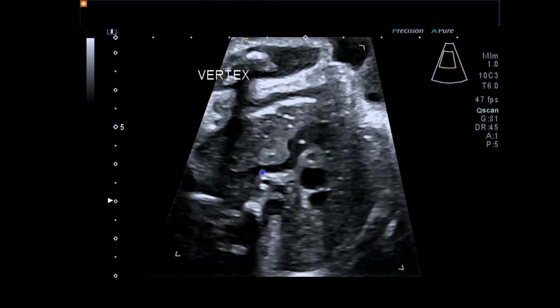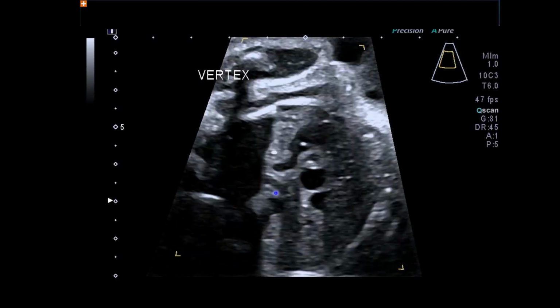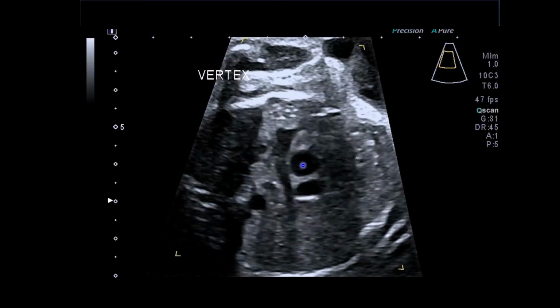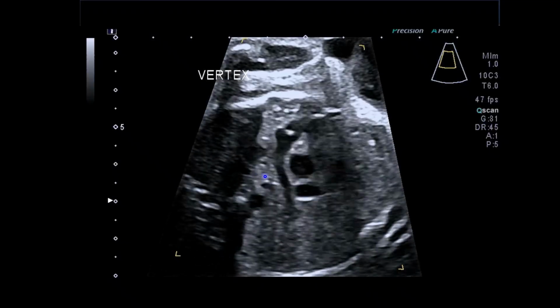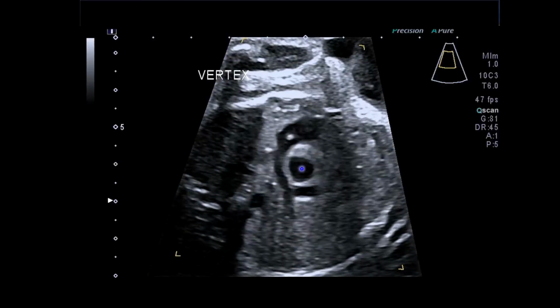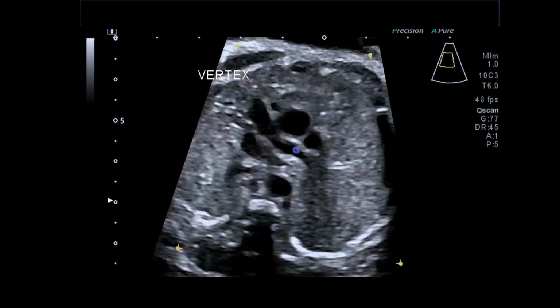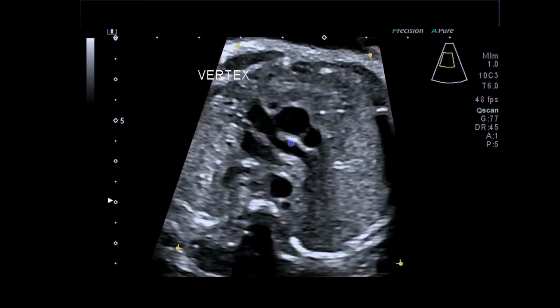There's the trachea. So it looks like this aortic arch goes to the right of the trachea. There's a better look at how small that main pulmonary artery and pulmonary valve are in comparison to the ascending aorta. Again, this is the SVC, and this is part of the bronchi here. This is the right bronchus, this is the left, and you're starting to see where the descending aorta is. So this is a right-sided aortic arch. Now, as we transition up higher than this, just past the main pulmonary artery and branches, you see this sort of tortuous structure here.